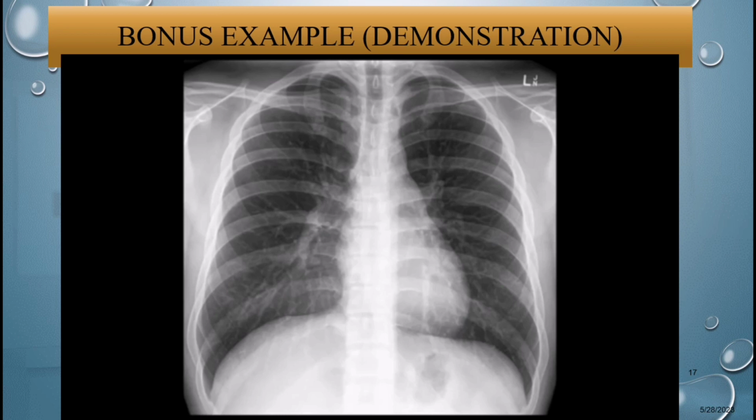So this is what I was talking about. If you put your finger here and here, with these two edges, you have to put your fingers, don't move them, just put them here. This is the end of the angle, so that's where you are supposed to put your finger.